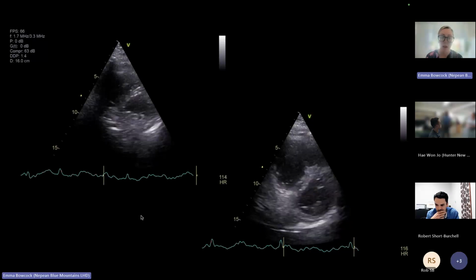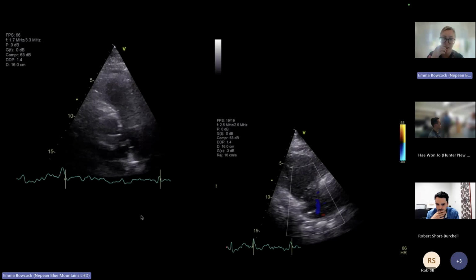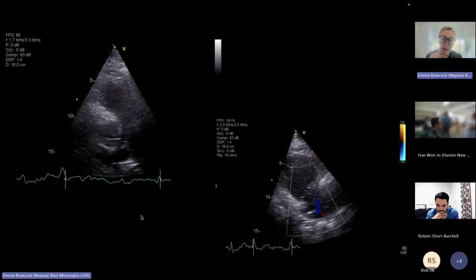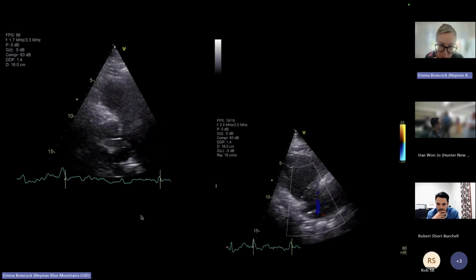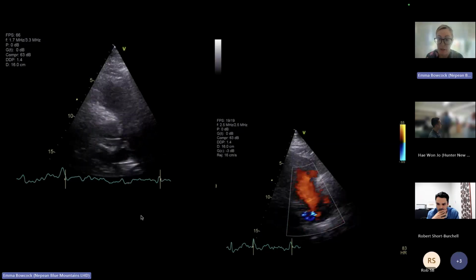And then you noticed this, which is really the key thing to recognize there. It's not often I put this case in, not because it's a particularly exciting PE case, as the images are not great, but it's not often we see clots in the main PA, which we can see here. So well done for spotting that. I'm not sure everyone would have necessarily spotted that.